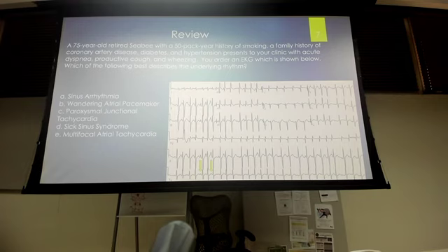Yeah, there's a family history of coronary disease, but we didn't say that in his history, but we did say that he has got some underlying respiratory problems, and he's had an acute respiratory exacerbation. So multifocal atrial tachycardia, we can see different morphology P waves on that bottom rhythm strip. Here you can see the V1, V2, V6 as their rhythm strips. That's okay, they all just give us different 10-second views of the heart. But in general, we'll see those three different morphology P waves going on.